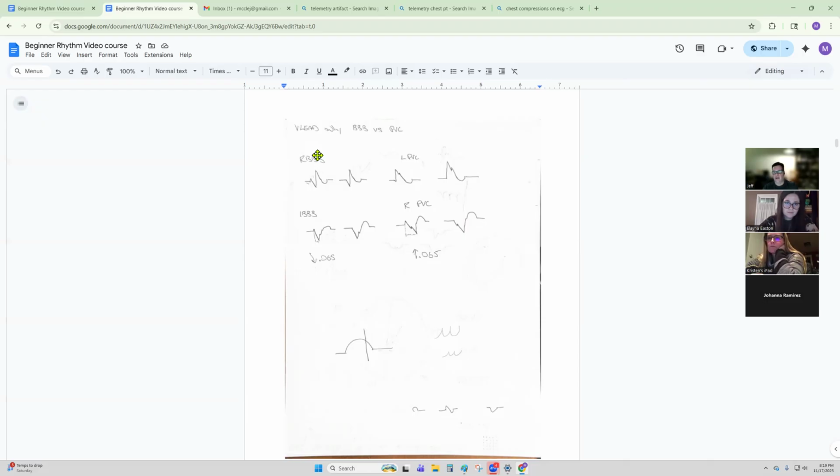So now you need to decide, is this a bundle branch block or a truly ventricle in origin? So using V lead, a right bundle branch block is going to have this biphasic pattern, bi or tri. So the septum activity can be there, doesn't need to be there. It's going to go negative below the baseline. It's going to go positive into a negative T wave, or a straight negative, positive into a negative T wave.